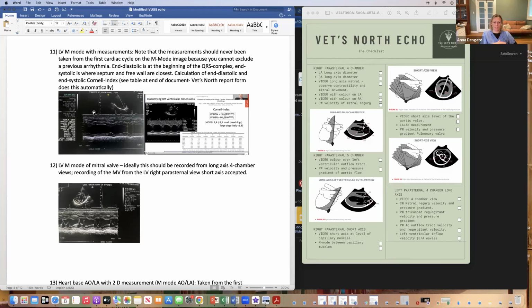So it does all the maths for you, essentially. We've got an automatic conversion and normalization according to weight using that Cornell equation. So we need to submit our form and have it look at it in the Excel spreadsheet to know what the normal ranges are and whether they've fallen outside. And fortunately, all of the coding that Nicole George has done, full credit to her, they show up as different colors if they're outside of normal range, which makes it really easy.